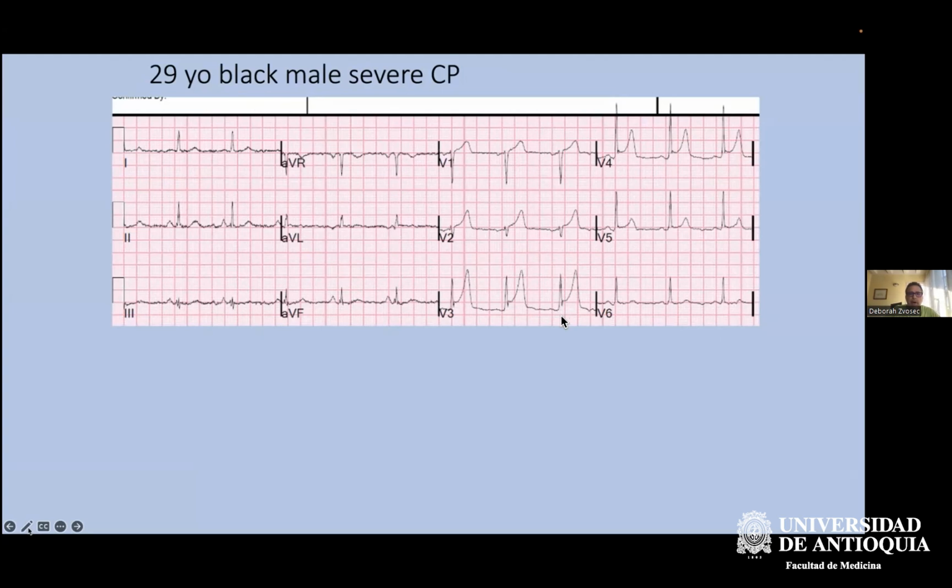We showed that in all cases of normal variant ST elevation, there is always an S wave or a J wave. In V2, there's always an S wave. In V3, 90% of the time, there's an S wave. And in 10% of the time, there may not be an S wave, but there's a prominent J wave. This has neither. So this cannot be normal ST elevation. It was not recognized because they thought it was just normal ST elevation.